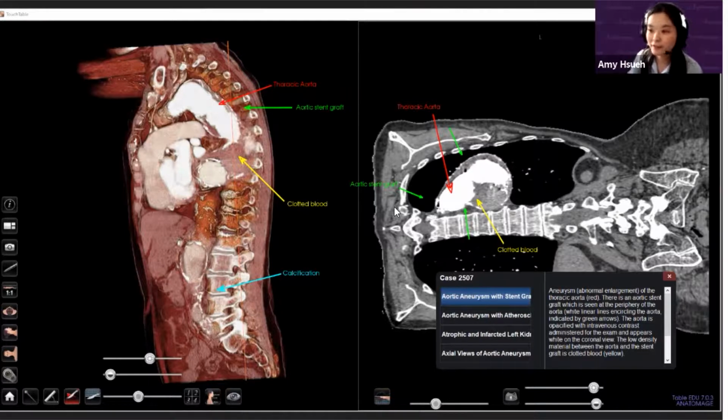And then for those of you that might be a little bit more radiologically savvy than I am, you will notice that it is a little bit off here, but don't worry, on your tables in the 2D, in the 2-monitor view, it will be accurate.